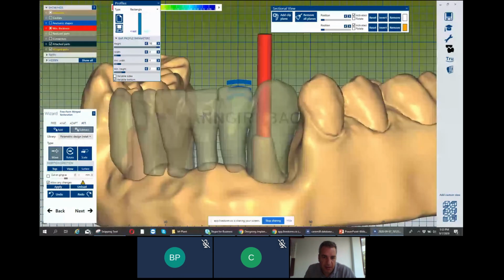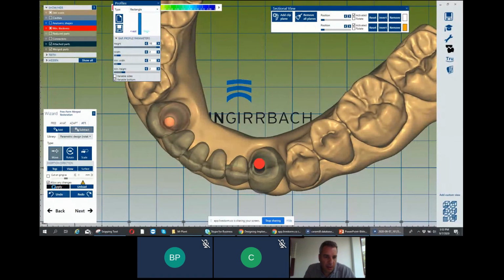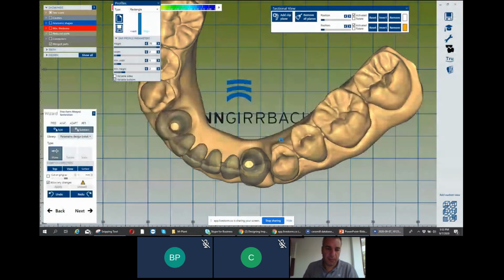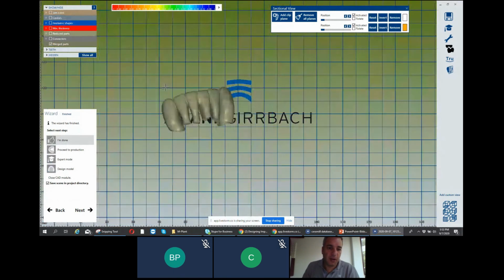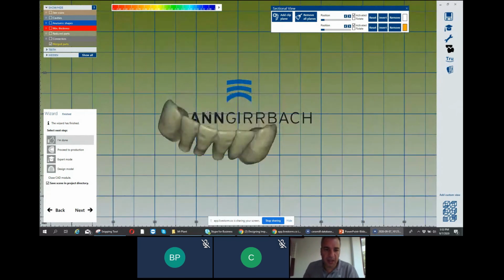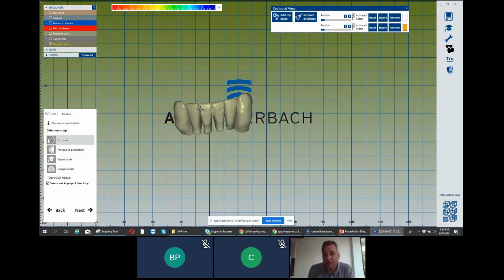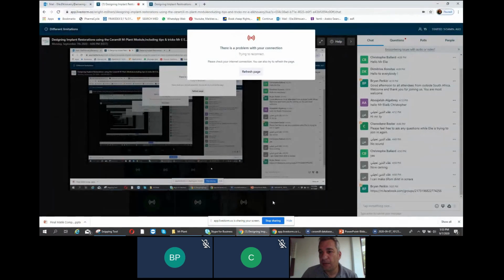You see, I tilt the screw now according to the view, apply, and now I have a screw-retained bridge. We will make a screw-retained bridge, which is made over normal abutments, but we create holes for the screw. Okay, this is a part we can use when we don't have the perfect Ti-base.